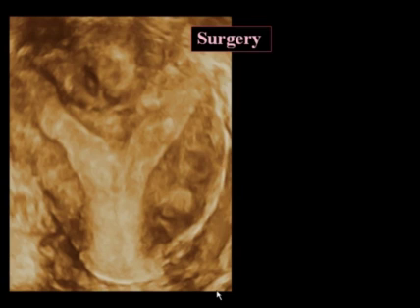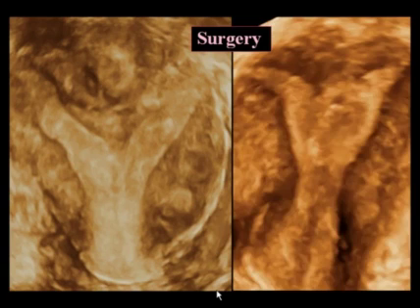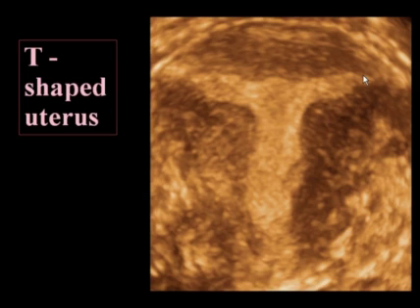Now here's a patient that had a rather broad and shallow subseptum, and there was a fibroid right in there, and she underwent surgery, and so we get to take a look after surgery to see whether they were able to shave down the entire septum, and in this case they were. The top of the myometrium here is a little bit ratty, but it is actually fairly straight, so they successfully removed the septum.